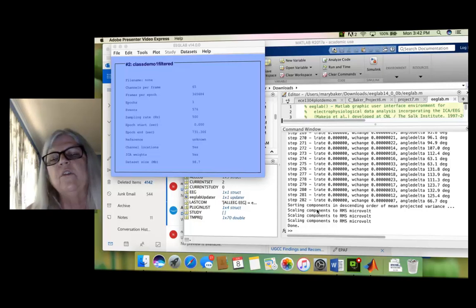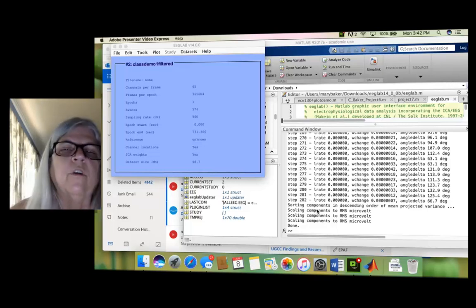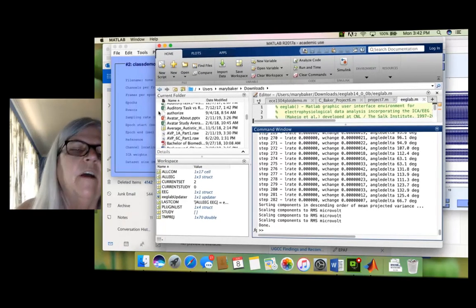Close as many windows as possible. As you saw, it was going very slowly for us because I was also running a background screen record and that was taking some time. So anyway, you can see that we are done now.